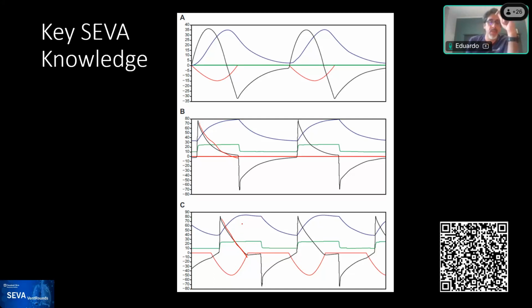Rob, before we dive into the next case, do you want to comment a little bit about this behavior on ventilators, please? Which portion of the behavior do you want me to comment on? The exhalation during inspiration and its effects. Well, on this particular ventilator, I think you're looking at simulated values of a Servo.